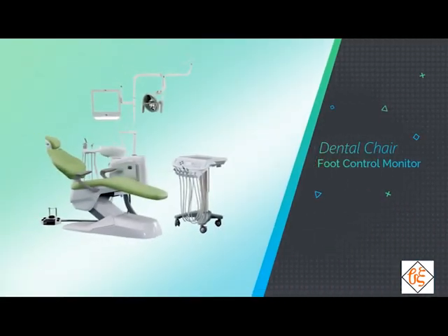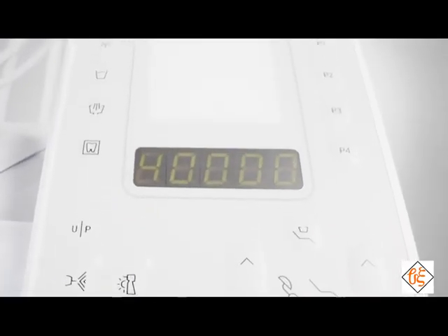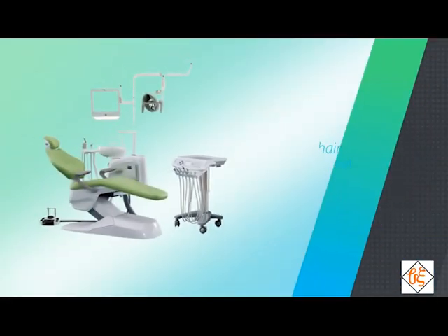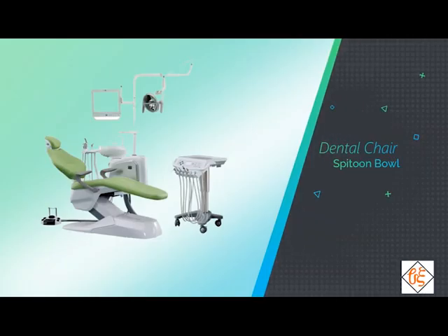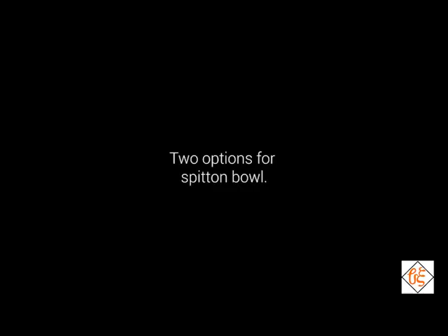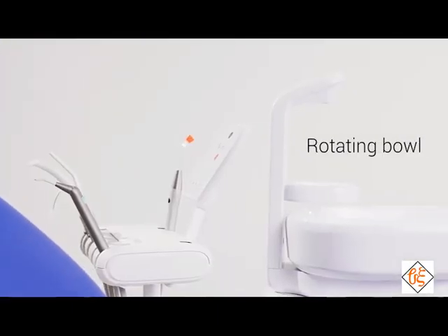The seventh component is foot control monitor. The foot control monitor is especially helpful for dentists when they have full hands. It has similar operating buttons such as the manual foot press and is considered safe to use. The eighth component is a spittoon bowl. It is a bowl or a basin where patients spit after gargling or simply spit their saliva. Moreover, it has a water pipe that flushes down the contents into the drain and keeps the basin cleaner.